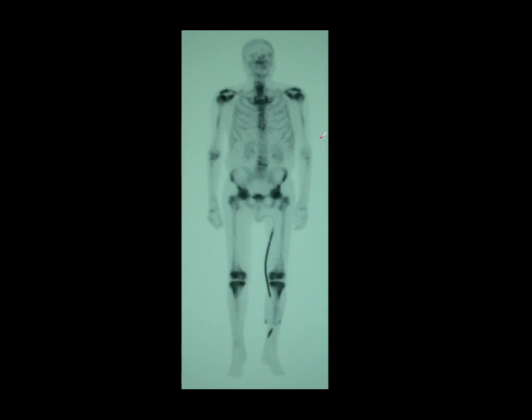And what's quite interesting about this is these patients will have widespread marrow reactivation, so they will have very abnormal looking MRI scans, and somebody might report an MRI scan showing very abnormal signal because of marrow reactivation, and then they might say, oh, let's do a bone scan to see what's going on. And you don't want to report this as metastatic disease. You want to make the correct interpretation of extramedullary hematopoiesis. So if you see this, go looking for an underlying diagnosis like polycythemia or myelofibrosis.